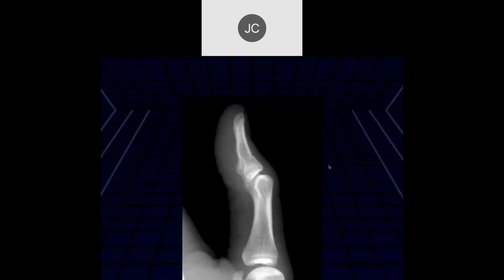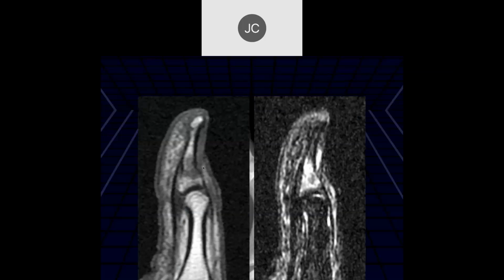Okay. And then here we can just remember if you have pain in a digit, also you need to remember you can get traumatic injuries to the bone. Here's a little buckle fracture of the cortex. Don't forget you can have fractures too that can sometimes masquerade as tendinopathy. So why don't we stop here, and then we'll start up a new section on Monday.